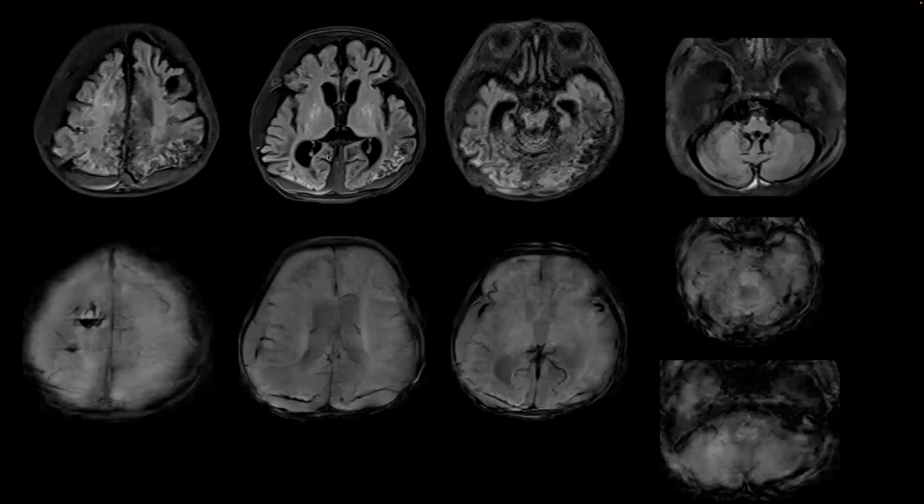On the FLAIR sequences, non-contrast FLAIR sequences, you have laminar necrosis predominantly in the posterior cerebral hemispheres, also along the bilateral basal ganglia, and subdural collections with some fluid levels along the parietal lobes on both sides. On the gradient sequences, again, you have these hematomas over there. There was some tortuosity of the vessels, but not significant. Only the convexity vessels demonstrated some areas of tortuosity.